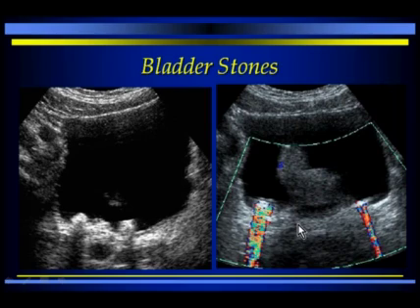Moving on to some other abnormalities of the bladder. The slide here on your left shows you bladder stones. So here you have the bladder with two echogenic foci, each showing distal acoustical shadowing, and these are stones within the bladder. If you ask the patient to turn or to move, you can visualize that these stones will move in the bladder. If one turns on the color Doppler, one can actually see a twinkle artifact, which is an aliasing type of artifact in the Doppler signal coming down from calcified stones. This mass, which is protruding into the bladder here, this is simply what we call median lobe hypertrophy from an enlarged prostate bulging into the bladder.